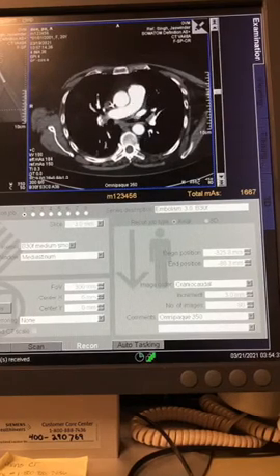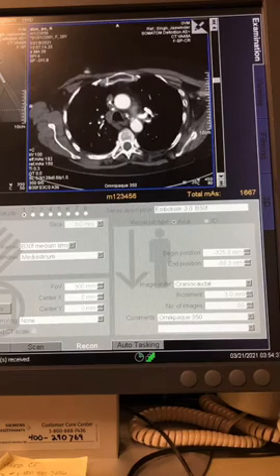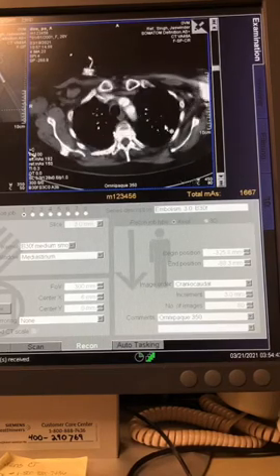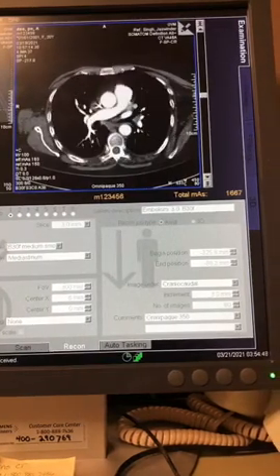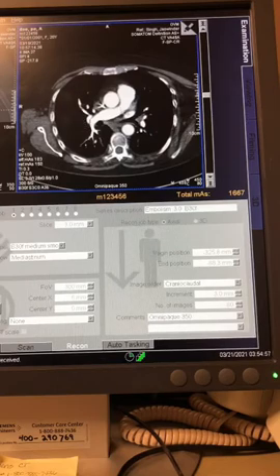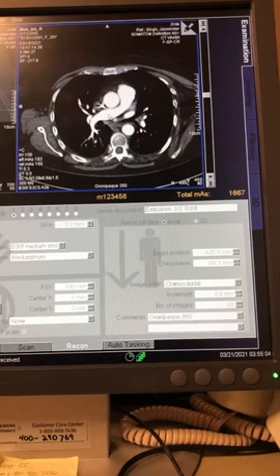These bright, beautiful trunk here. And then the vessels. And the rad's gonna look at this vessel and just follow it out and look for where the contrast goes black. This person doesn't look like they have a PE. A lot of times the patients that are incredibly symptomatic, their ears are turning purple, they can't breathe, they might be dying, right? Because PEs can be fatal. Those are gonna have big blacked out chunks right here through this area, and that's a very obvious PE.